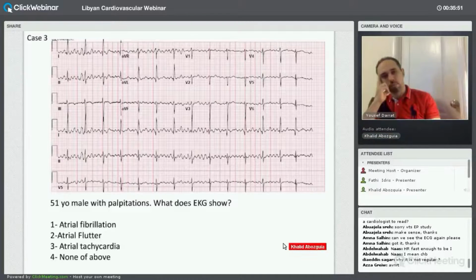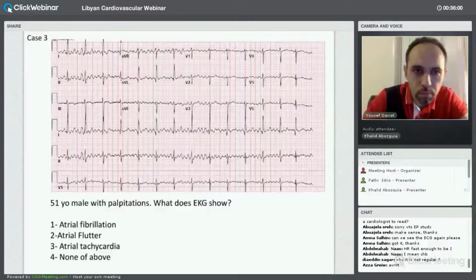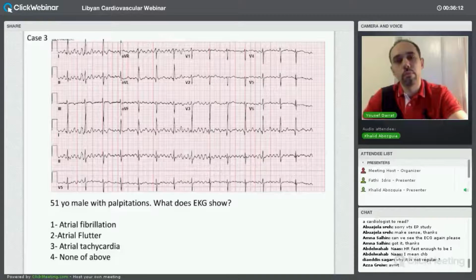It's lead 3. You can see lead 3 very beautifully. There is a P wave, QRS, very nice flat line. Remember, this lead 3 correlates to your rhythm strip. So this part here, you are in sinus rhythm. As Yusuf suggested, this is not physiological, it cannot be a flutter wave. This is just too fast. But the clue here is really lead 3. So this is sinus rhythm. And at the same time, your rhythm strip is showing this artifact. And we all know that this is very common in patients with Parkinson's, or if there is any interference with the ECG machine.